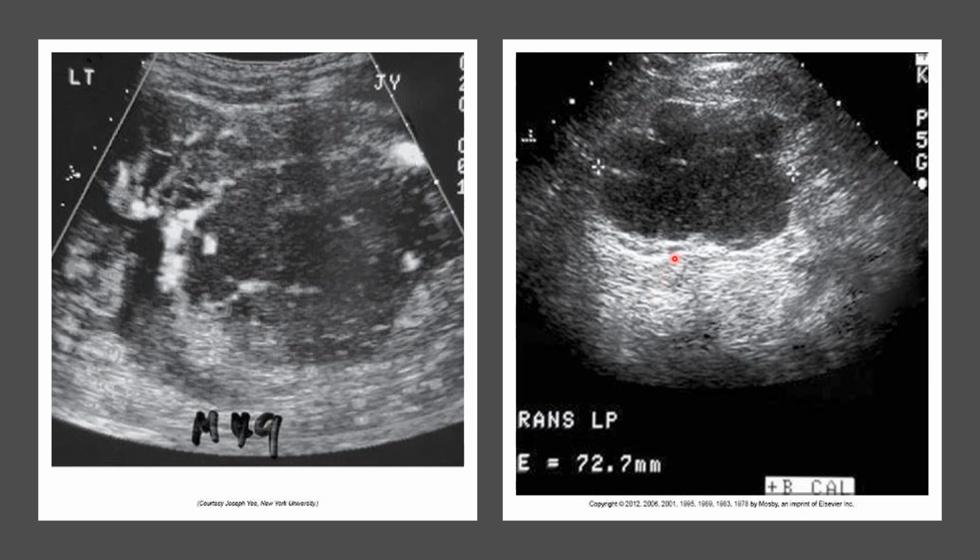Over here, same thing. We've got what appears to be mostly a cystic structure, but notice that the wall is not well defined, smooth, and thin, right? We get these indents and lobulations or irregularities to the shape of the cyst. And again, we've got a lot of internal debris and echoes going on in there.